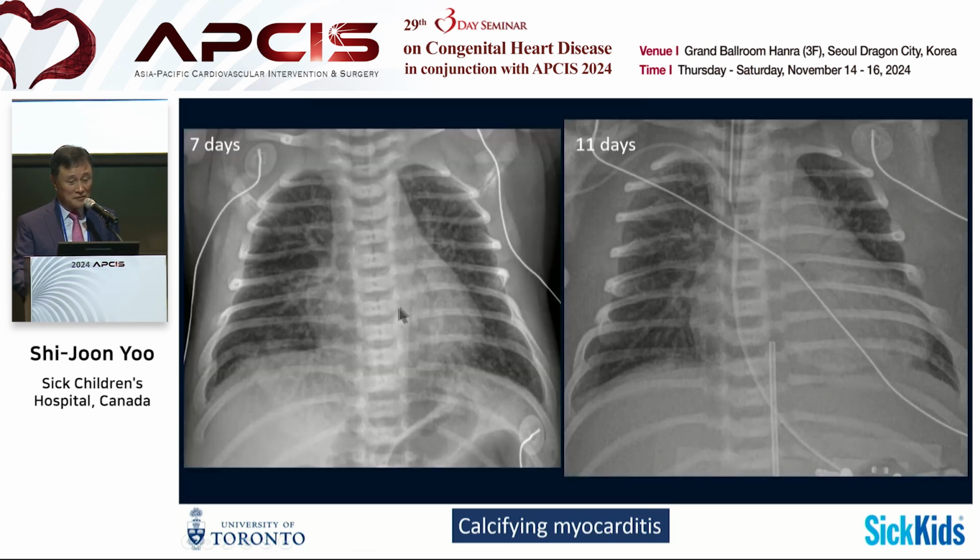Looking at this, at 7 days, there is just cardiomegaly; I don't see any calcification. But at 11 days, knowing that this patient has this, can you see the calcification here? So I'm showing you from the overt manifestation back to when you can first see the calcification. Only 11 days, and within a few days you can see the calcification.